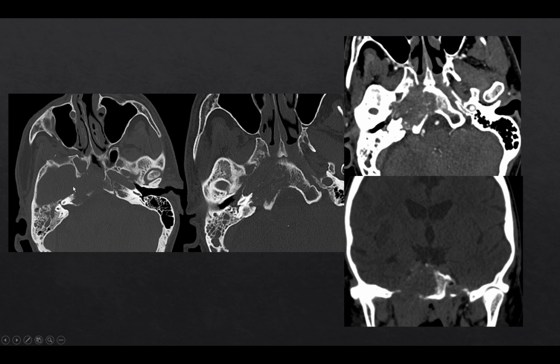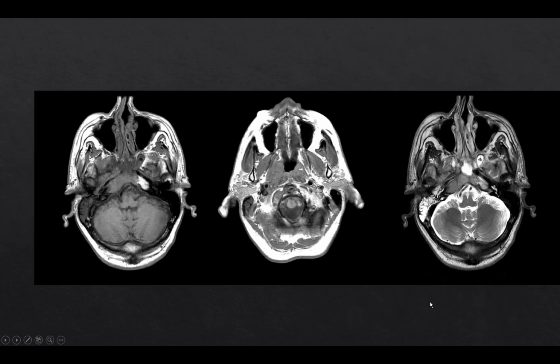And again, we have a lytic lesion of bone within the right petrous apex involving the central skull base with a broad zone of transition with cortical breakthrough. On coronal imaging, we can see this well. And we have MRI showing the same mass, hypointense on T1, actually crossing midline, with abnormality involving the nasopharynx on the right, which is very important to talk about, and the same findings on T2. This happens to be a squamous cancer with direct spread from the nasopharynx.